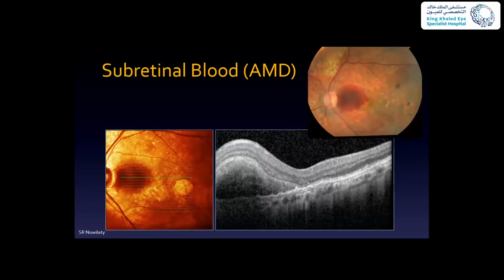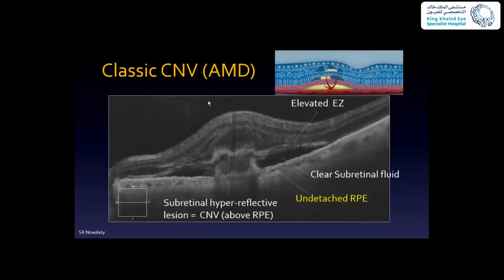It doesn't really give the choroid the chance to get all that fluid, or get all that light. So you have a tremendous shadowing in the back. It gives you this progressive shadowing. Okay, now let's look at how CNV, choroidal neovascularization, looks on an OCT.